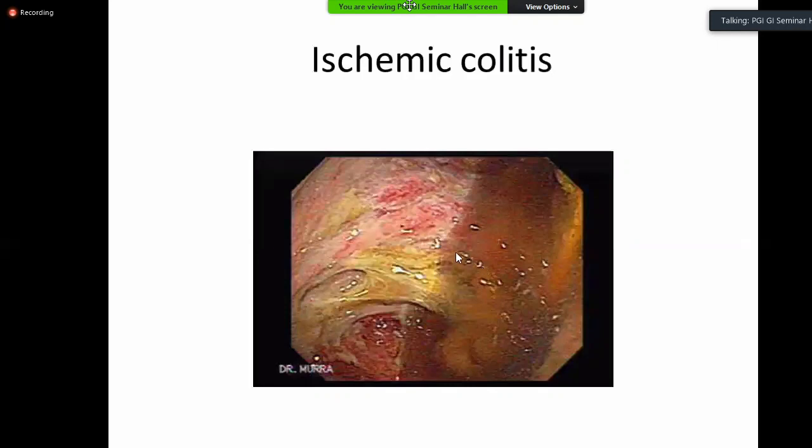Now, ischemic colitis is an uncommon entity. The ulcer may be large, may be stellate, may be associated with hyperemia, may be associated with narrowing. So colonic ulceration in a patient with GI bleeding, again, will have a different connotation as compared to colonic ulcers without bleeding. An elderly patient with rectal bleeding, a patient of hypertension, ischemic heart disease, you find large geographical ulcers in the sigmoid or at the splenic flexure, your first diagnosis will be ischemic colitis.